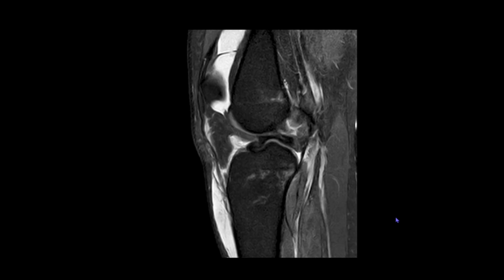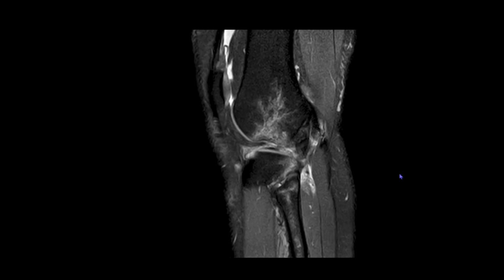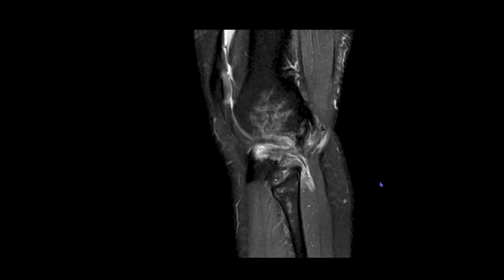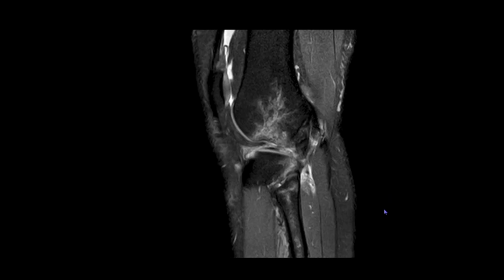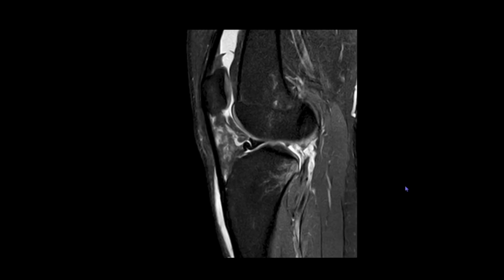Then now going on to the lateral aspect, as there is a bucket handle tear, we would expect the popliteomeniscal fascicles, which should be here somewhere. They are not seen, so they are likely to be torn, and there appears to be injury of the popliteofibular ligament as well, and the arcuate ligament, the posterior most aspect, which along with the capsule would be forming here. This appears to be deficient, and the knee joint fluid is seen extravasating in the posterior aspect of the knee joint.